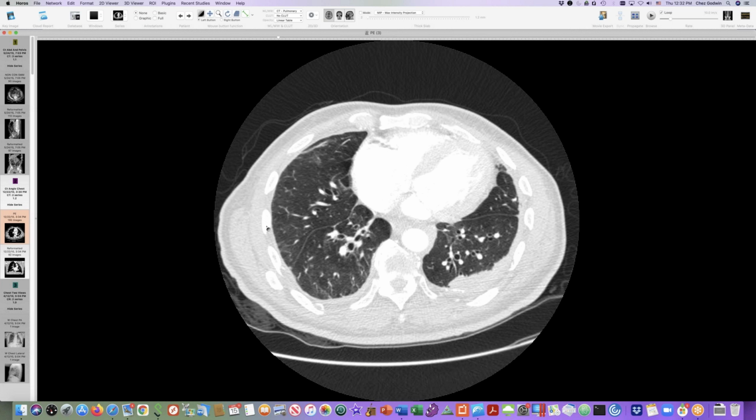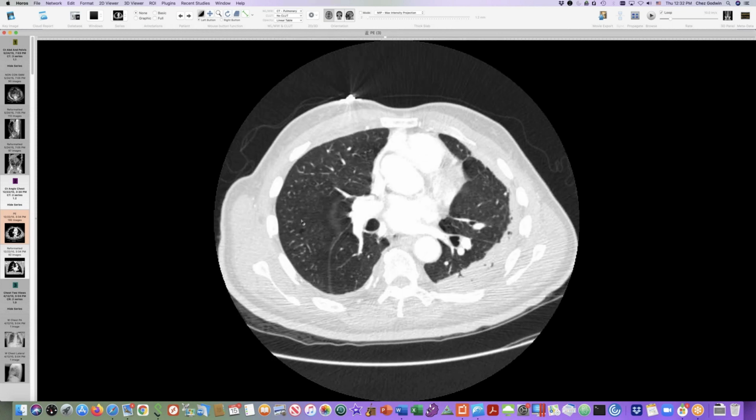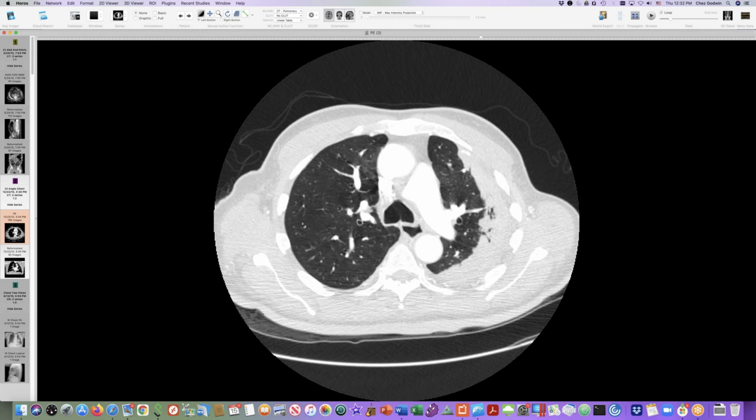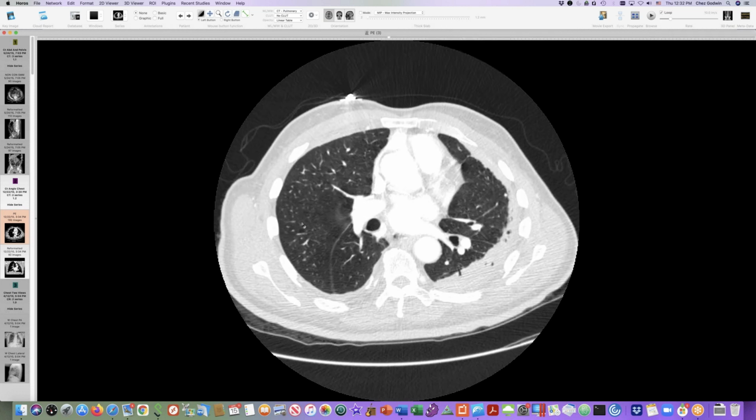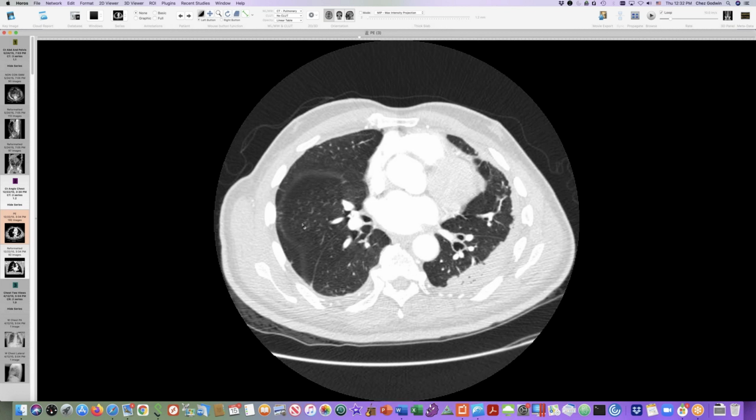Then we have some round atelectasis down here in the right base associated with a pleural abnormality, some of which is due to his asbestos exposure. So this is the most extensive case of retroperitoneal fibrosis I have ever seen, with just these enormous pads of tissue down here in the periaortic region, and then the ureteral consequences of retroperitoneal fibrosis. So I've never seen IgG4 disease with this particular manifestation. And we don't have a diagnosis of IgG4 lung disease. The man died a couple of years ago, and at the time of diagnosis, they did not look for IgG4. That diagnosis hadn't been invented yet.